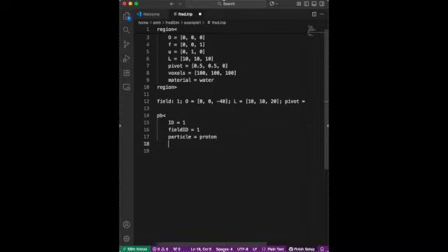Yeah, the particle that we are going to simulate is protons. Let's do it with 100 MeV. The energy full width half maximum would be, let's say, 5 MeV. That is the realistic case. In a realistic case, we never get exactly monoenergetic proton beams.